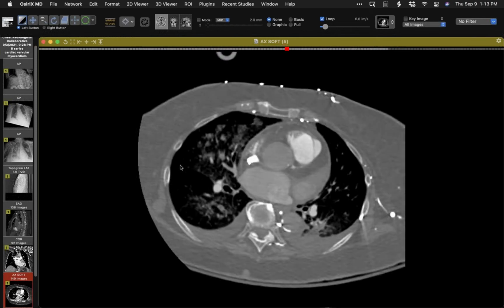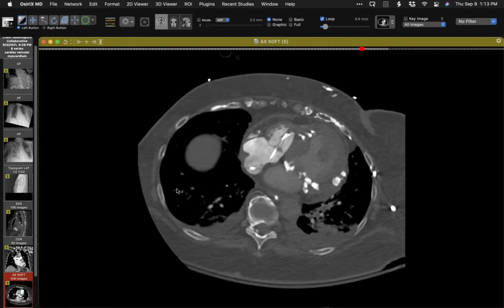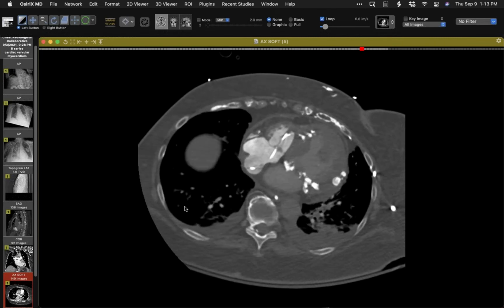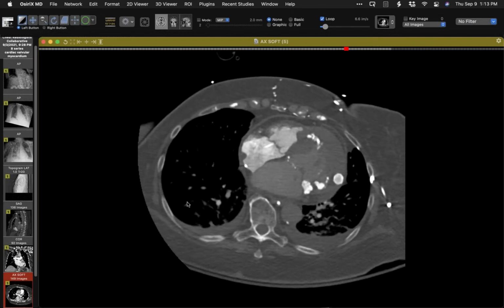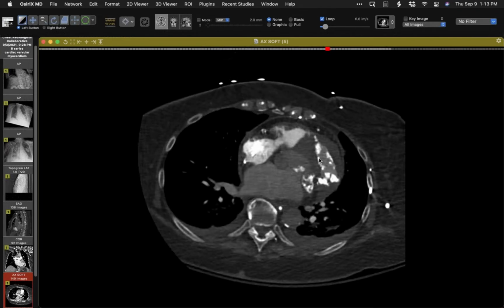Let's look at the strange calcifications, and we'll see it's a lot more than just extensive calcifications related to the mitral valve annulus, but there are calcifications in the myocardium in multiple locations. And this one, which is relatively large here, I'll change the contrast here, clearly has relatively high attenuation in the center of it.